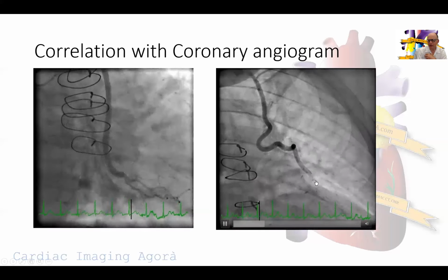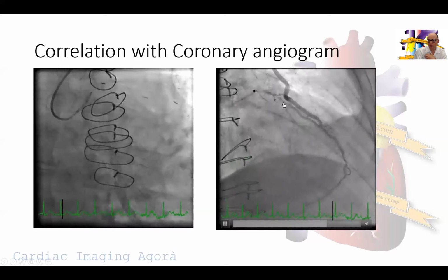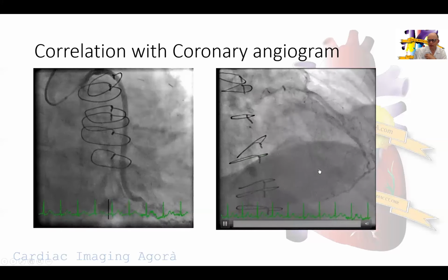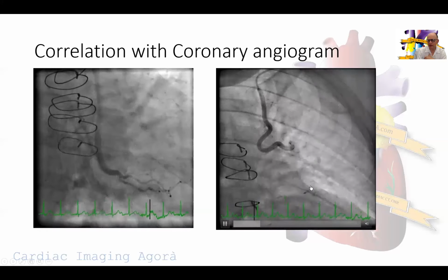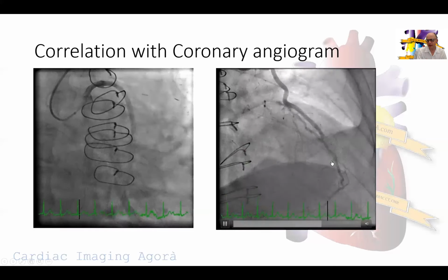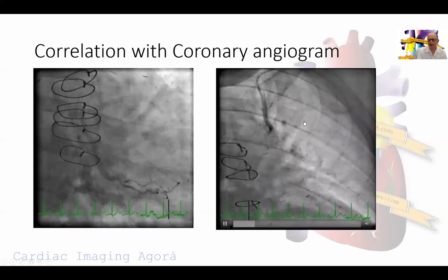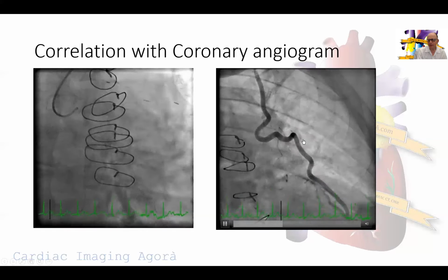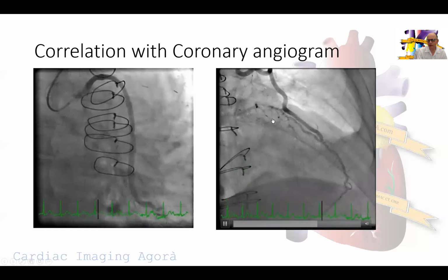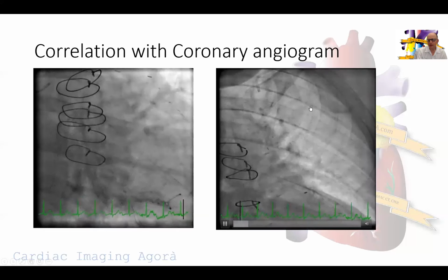However, if you pay attention to the proximal segments of the left anterior descending artery, they're all trapped within this ischemic zone. So these are the septal branches, all here severely diseased. Despite the fact that you have a patent graft distally, proximally, everything is ischemic and trapped within this obstructive coronary disease area here. The diagonals too are there.